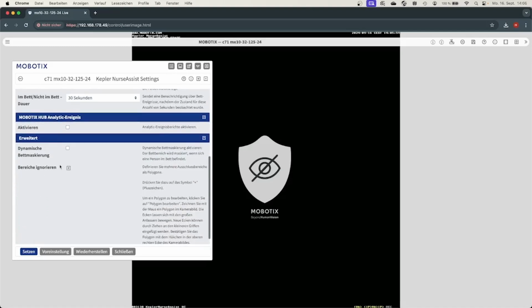In the advanced field of the NurseAssist settings, there you have the area which you can ignore in an image. By default, the whole image will be used to detect people for fall detection, for example. But you can also shrink that to specific areas in the picture if it's necessary.